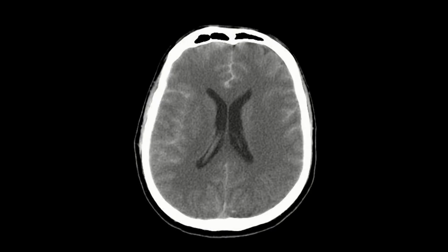In this particular image, you can visualize almost the entirety of the lateral ventricle. So you can see almost the whole of it. In between is possibly the septum pellucidum. So you can see the sulci over here, all through. So let me clear that up.